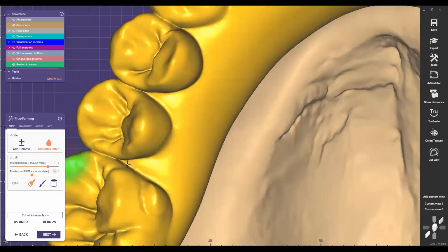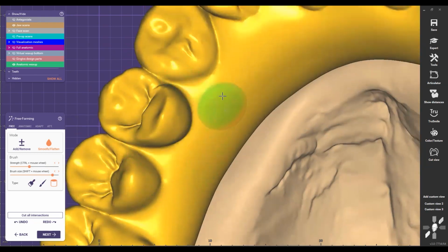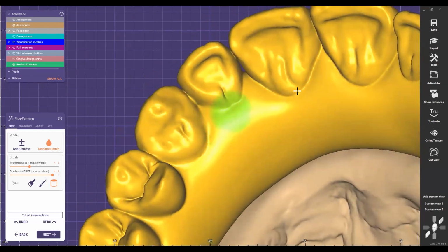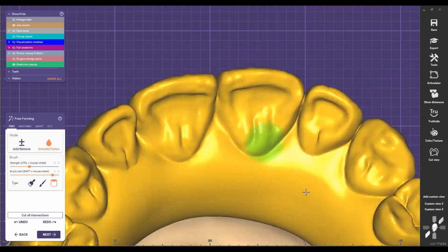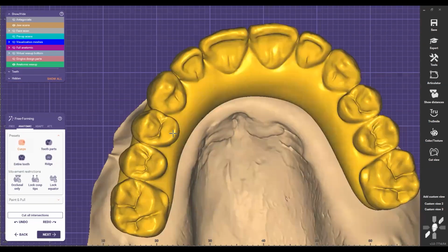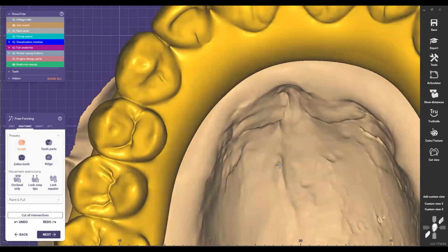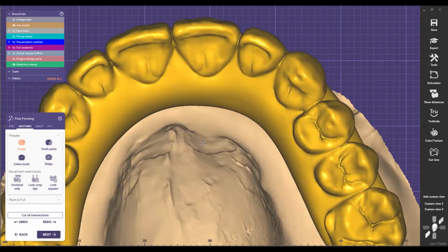I like to start making this right here. No, not too much, but less. So I create nice reinforcement there, especially for printing, right? I don't want those areas to be a weak spot and then break from there, right? I want to reinforce this pretty good. And then I just add this here, and I can just go and start bringing this out, so I can reinforce those surfaces. And I know that thing is not gonna break from there because that connector is wider, right?